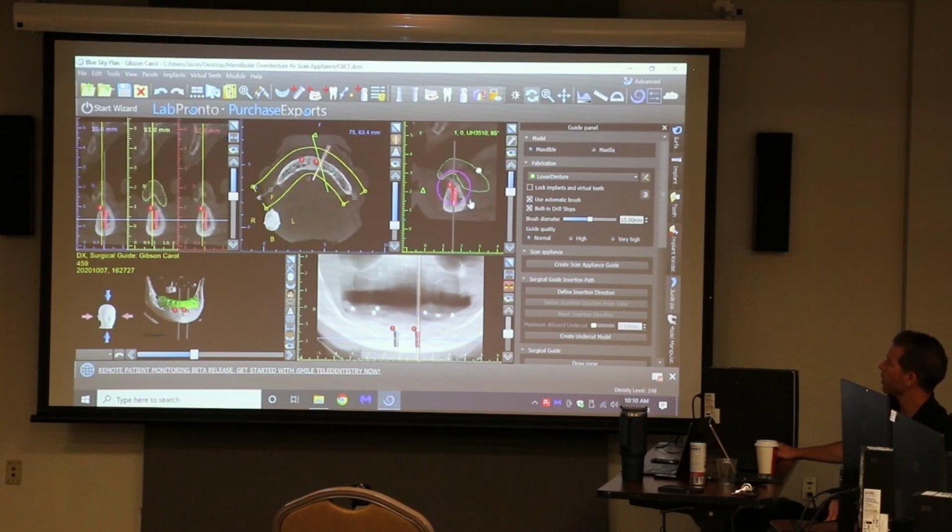And now we've got another one. Let's just say we spin it around, and we like the position. We're happy with it. Let's just say we're good to go here. We won't spend a lot of time with the Y behind it. But you do need to think, look at this little knife edge ridge.